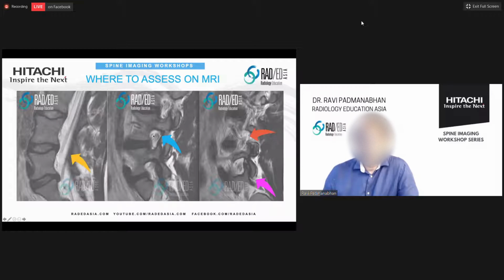Here's the exiting nerve root. This is the exiting L4 nerve root. And then we look as far laterally as we can on the sagittals as well. So it depends on your field of view how far laterally you go, but we go out as laterally as possible. The other thing is that you then also look at these posterior areas. So this is where you're going to get these posterior paravertebral cysts, the ones that don't involve the nerve root.